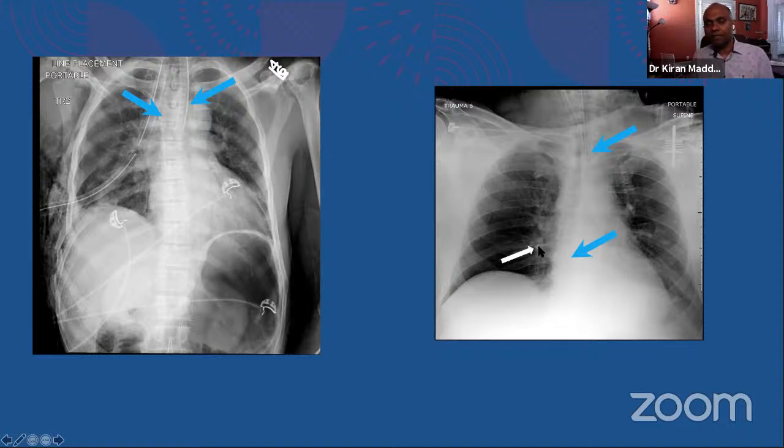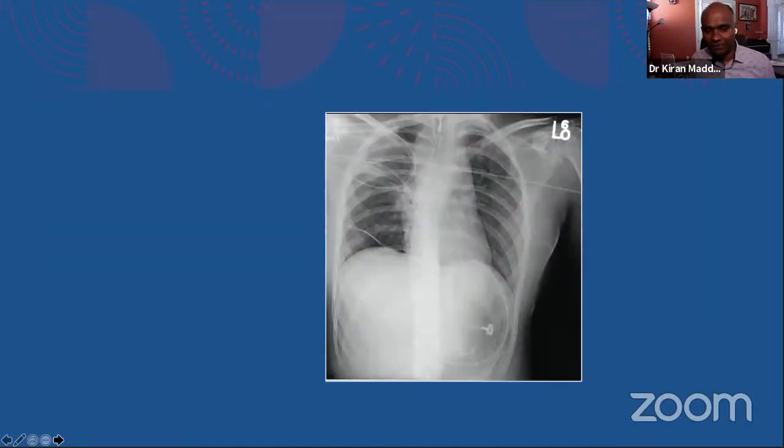If this is missed in the initial evaluation, you may treat the patient for trauma and its complications, but he will end up with obstructive pneumonia, fever, and septicemia. So these are some of the classical examples which I always show to my residents to understand the ramifications of anything missed during the assessment of the tubes and the lines.